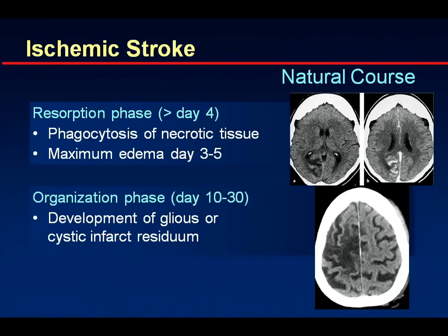If you do some imaging during this time and you decide to give contrast, you will frequently find these enhancing areas because of the leukocyte infiltration, which is now so strong, and the loss of the blood-brain barrier, that you do see contrast enhancement in this region, which at some point will make it difficult to distinguish that from a tumor. So the classic anamnesis plus the imaging on the non-contrast scan is enough.